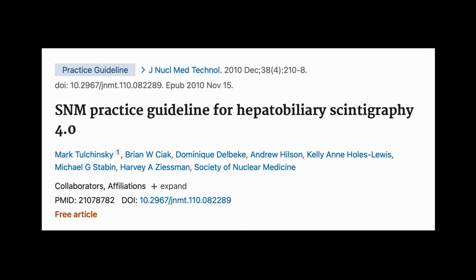The ejection fraction calculated by doing the ROI analysis was only 11%. Normal, we know, is about 35%. Anything less than 35% is considered abnormal, and so we diagnose gallbladder dysfunction or chronic cholecystitis in this patient, probably the cause of their right upper quadrant abdominal pain.